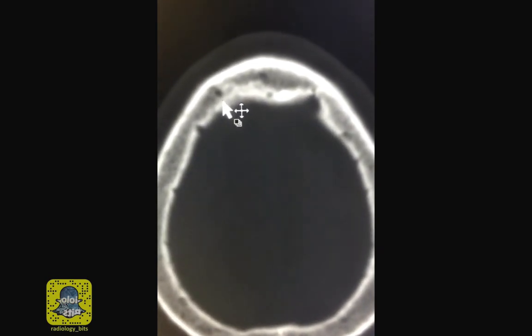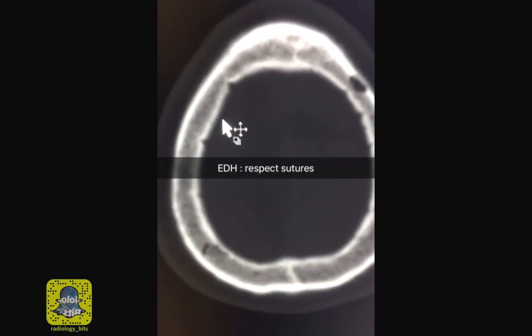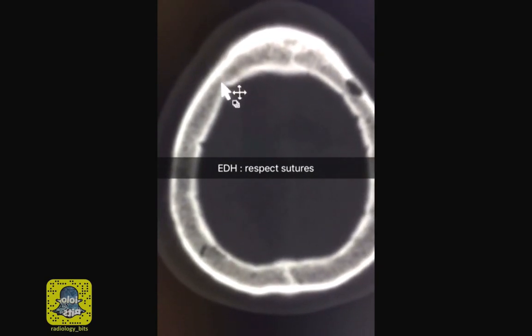Remember the sutures seen better on bone window, such as this suture here. Since the dura is stuck to the bone of the skull, the epidural space where blood may collect is confined by these sutures. So if you have an epidural hematoma, the blood would respect sutures. It does not cross them.